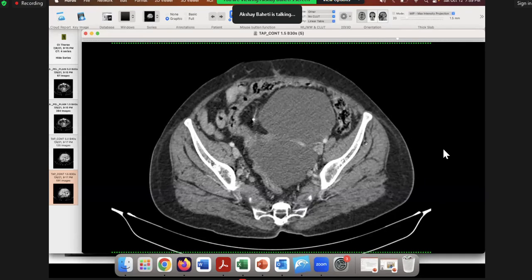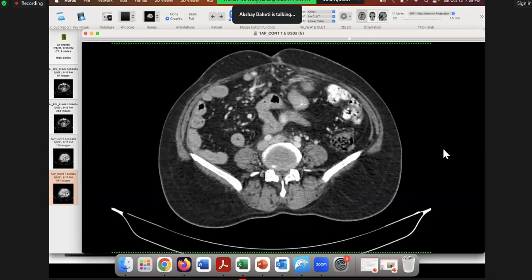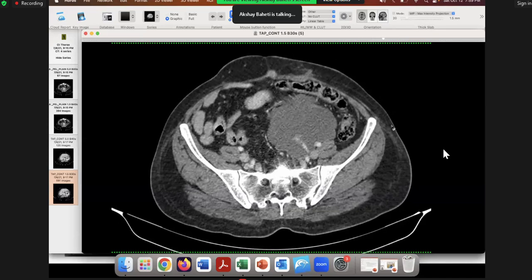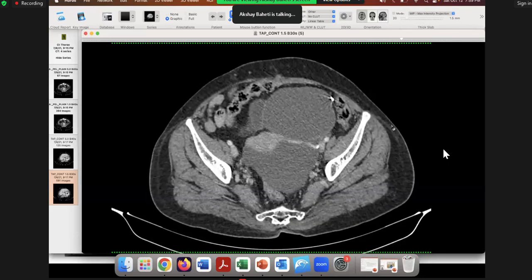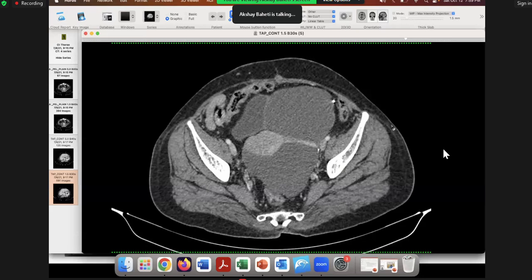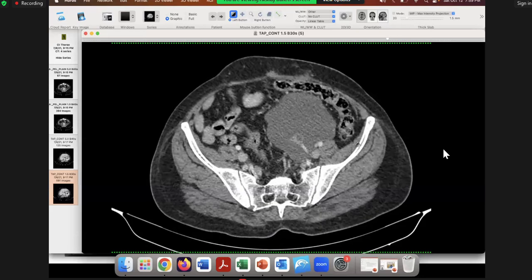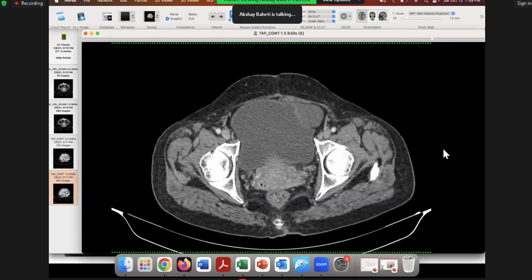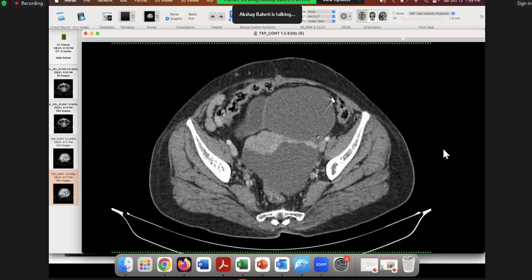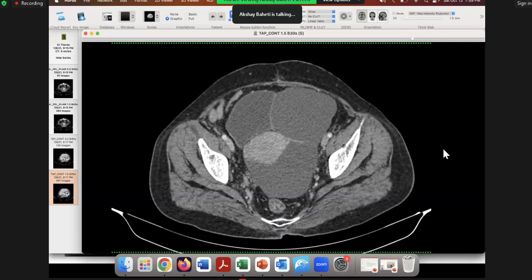All right. So ignore everything else. Just look at the adnexal lesion. All right. And so this is the lesion. What do you think? The right adnexa is fine. Nothing on the right side, right? It's just a left adnexal mass and the POD, right? There's something in the POD as well. Okay. Now, what do you think is happening here?